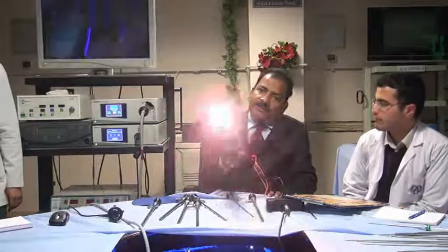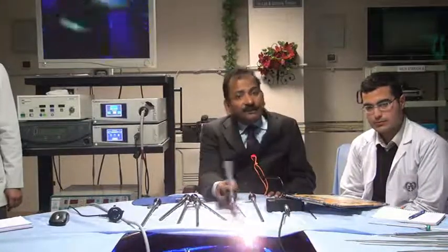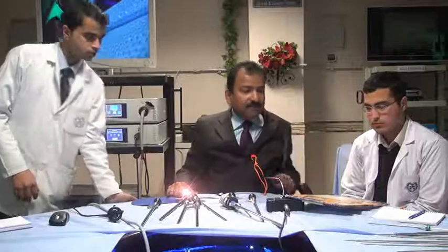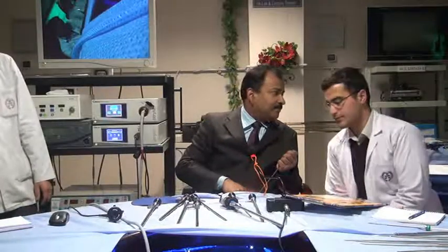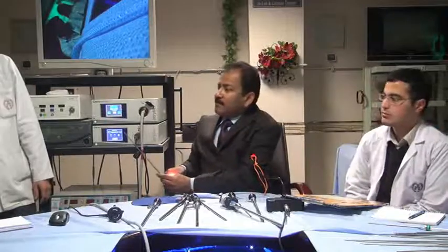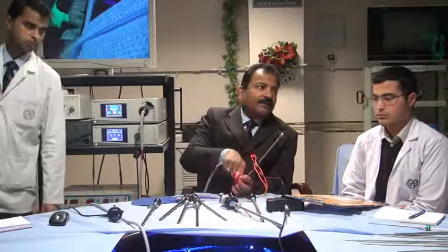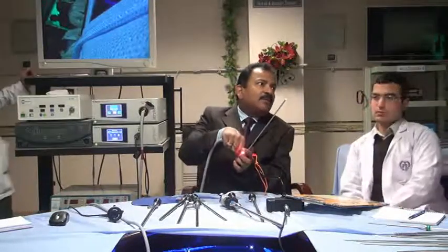So this was regarding the telescope, which you should always keep up, even in the 0 degree also. Because even in the 0 degree nowadays, you will see, this is 0 degree telescope here. See, the light is only on the top. There is no light on the bottom. I am not directly attaching it, otherwise you cannot see there. I am keeping it away. But see light on the top only. And the lens is below.